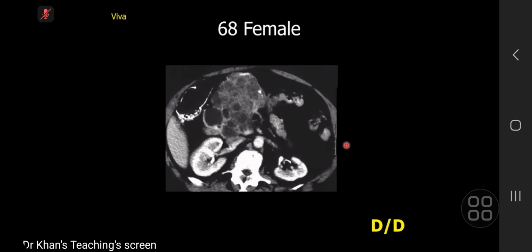Okay, so I am presented with a spot image from the CT abdomen with arterial phase contrast enhancement. There is an obvious abnormality, most likely in the head or body region of the pancreas, which appears multi-cystic with cysts of various sizes. I would measure, as in normal practice, how the largest cyst measures. And then there is a speck of calcification, a coarse calcification in the periphery.